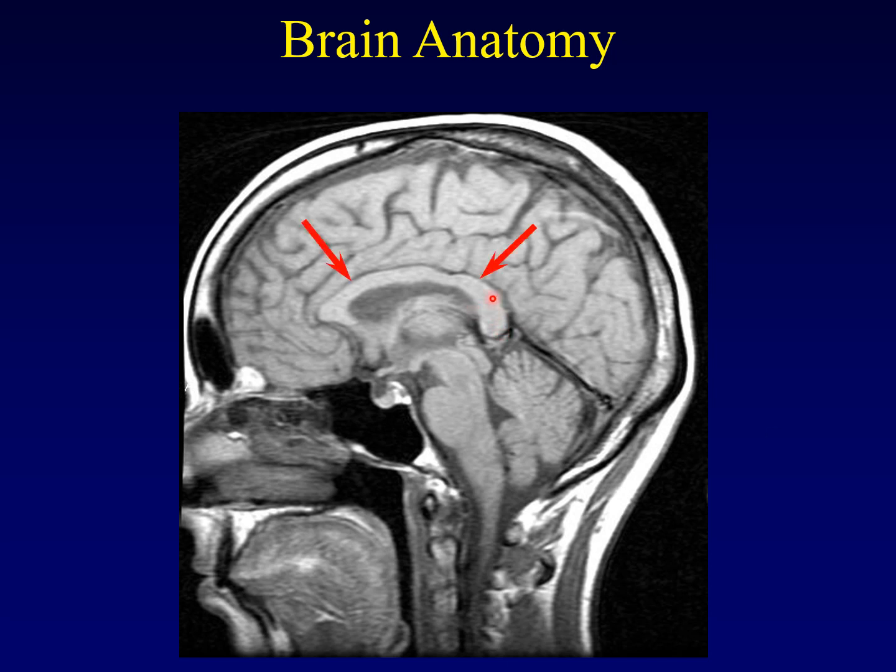How about this thick object right here? It's right down the middle of the brain, right? Running front to back there. This is the corpus callosum that connects the two hemispheres of the brain, right? And that's about a normal thickness for a corpus callosum. That's how thick you want it to be.